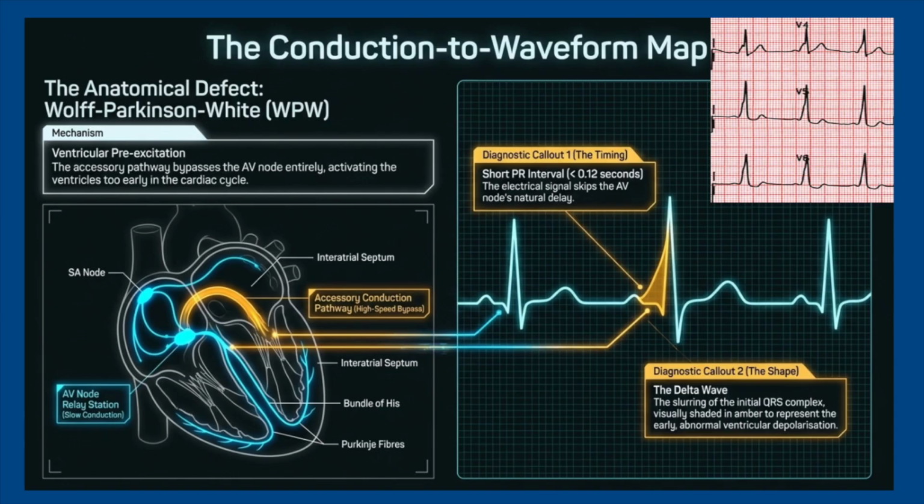Why? Because the normal impulse coming through the AV node and AV bundle will catch up with the delta wave and continue the stimulation. This is called Wolff-Parkinson-White syndrome, which is due to an accessory bundle between the atria and ventricles, leading to such an ECG picture.